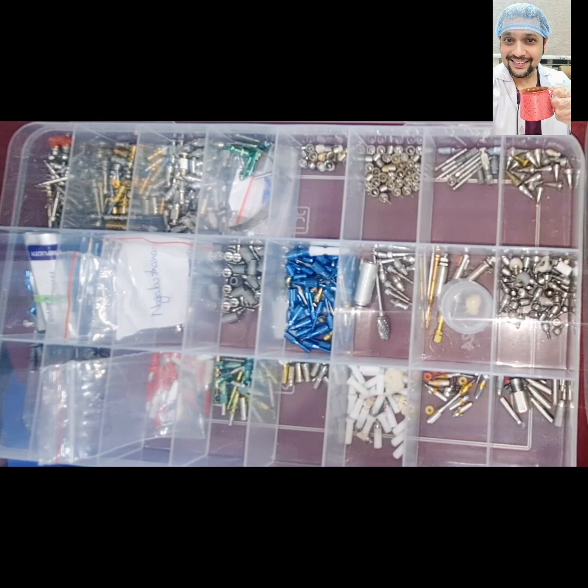The lab technician can do it, and the lab technician can prepare a crown over it. So usually with this explanation you can understand that a stock abutment is used primarily for a cement retained crown or a screw cement retained crown. Usually we cannot layer ceramic over the stock abutment, but now a few companies are coming up with stock abutments where you can layer ceramic as well.